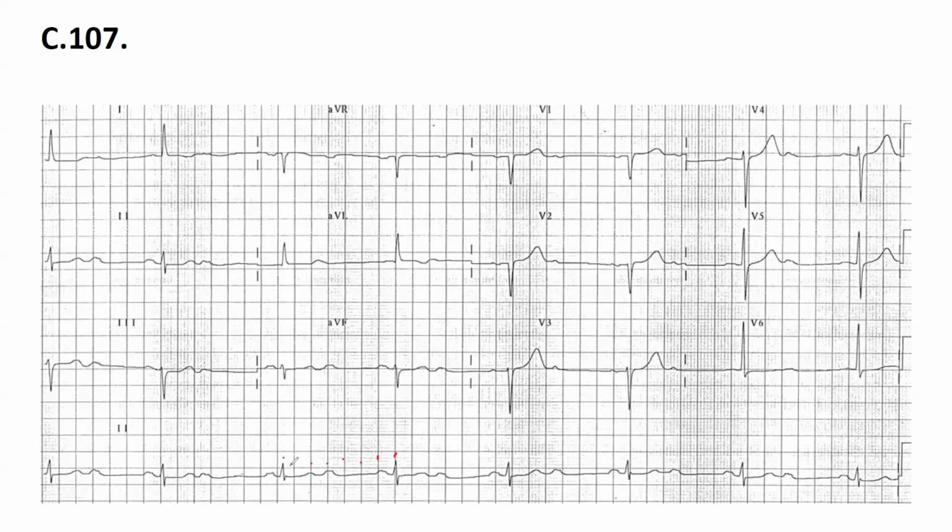Because when we discuss what the normal sinus rhythm means, first of all, it's regular, initiated by the sinus P wave. Every P followed by QRS, and the PR is normal. Here, I don't think it matches all the criteria. Correct, so that's not a normal sinus rhythm for sure.